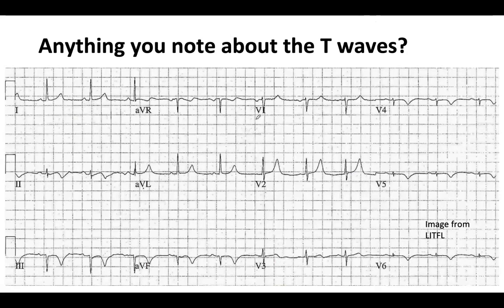Okay, so also inverted, so let me just close this. Inverted in lead 2, in lead 3. Let's have a look. Also inverted in AVF, and upright here, upright, inverted in 4, 5, and 6 also.